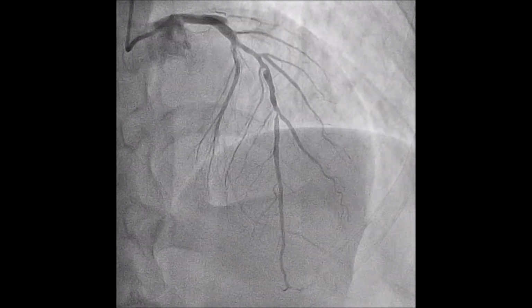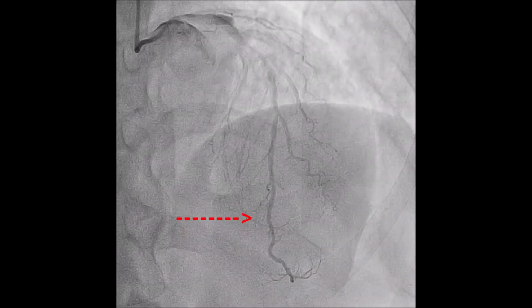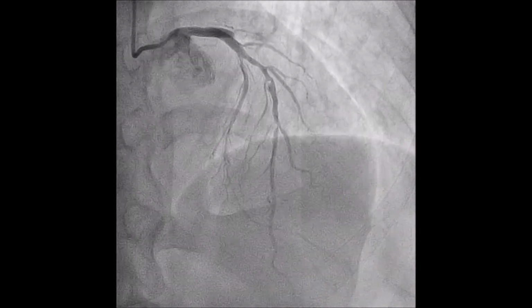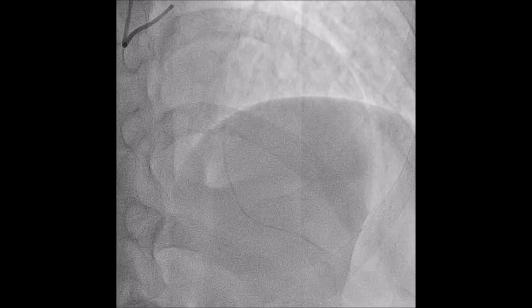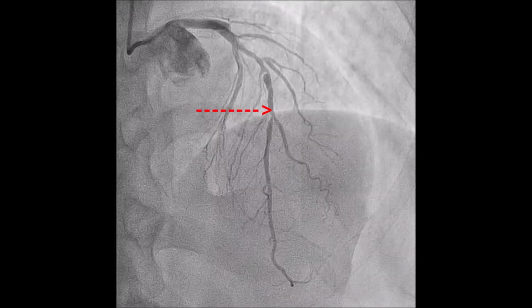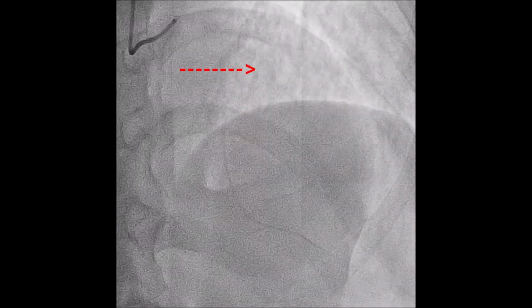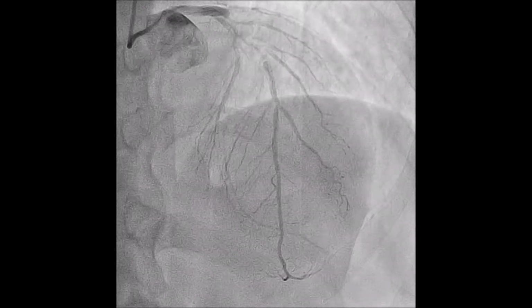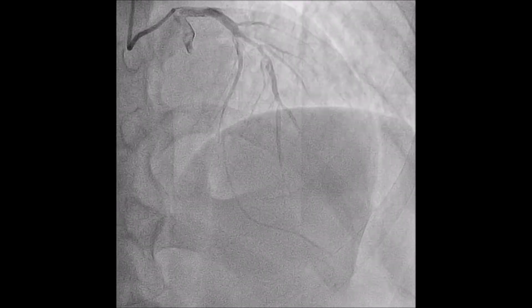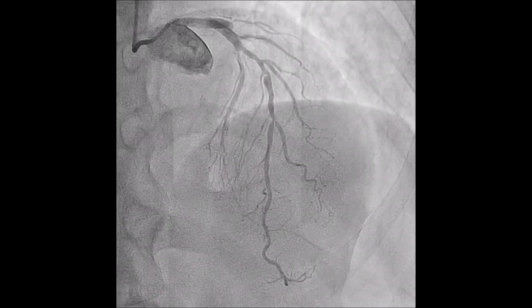The first observation that calls our attention is a greatly developed artery that tours the anterior wall of the left ventricle and gets to the apex of the heart. We are talking about the anterior descending artery, and as you can see, it presents several lesions on its middle segment, some very severe and complex, but the artery is open, so it is probably not the one responsible of this infarct. We must seek out the closed artery, an artery whose journey also coincides with the infarcted territory. Have you found it?